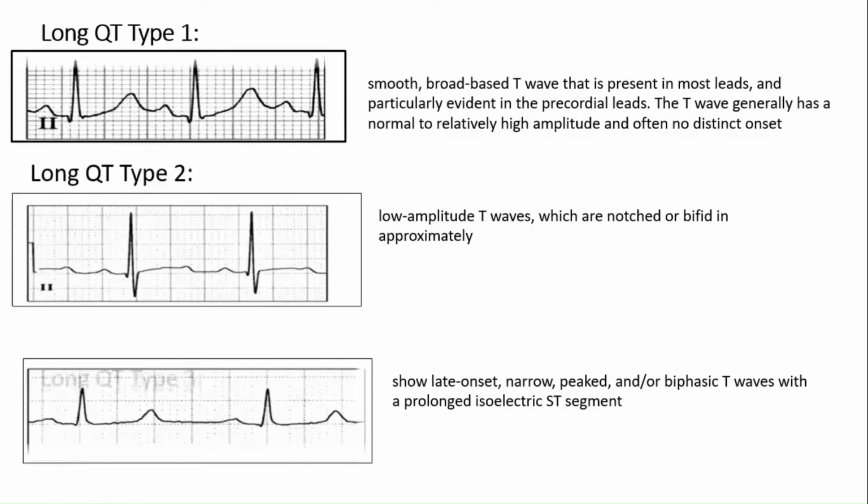Just remember these things. Just remember the picture and identify. Just remember long QT2 or long QT3. Anything not 2 or 3 is long QT1. So if you can't remember QT1, remember QT2 and 3. I think they can be remembered pretty easily.